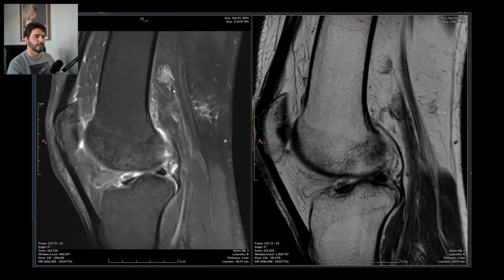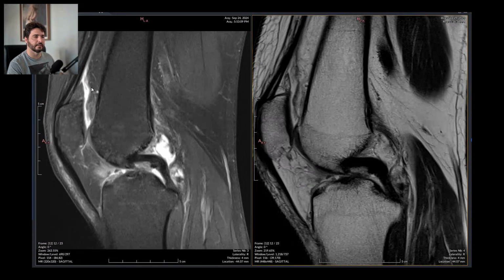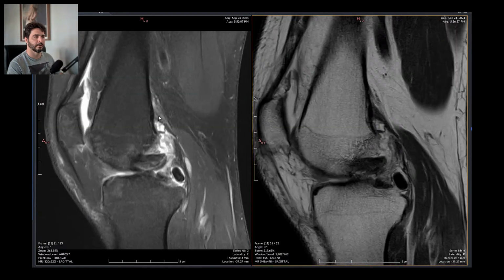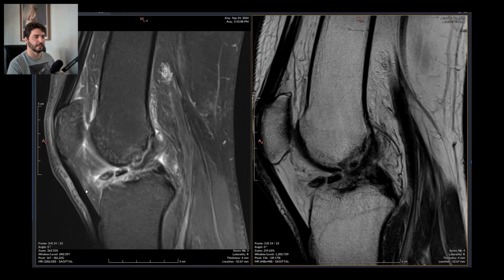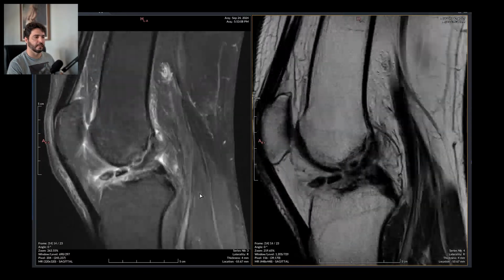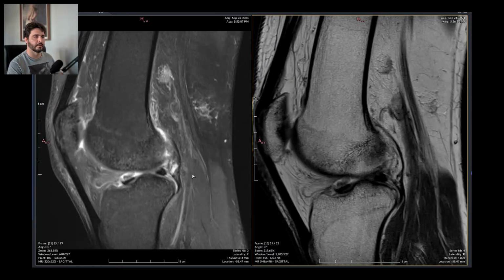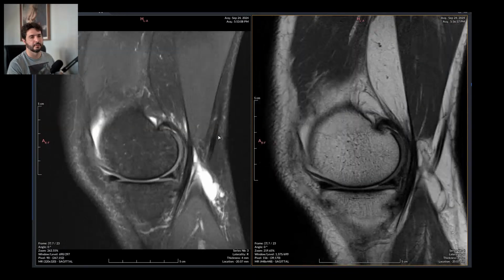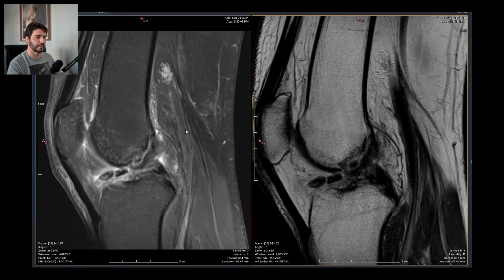First of all, there is edema all over the place. There's a small articular effusion, clear signs of synovitis. It's all blurred on the margins, and there is edema on the fat pads. Also, these are popliteal lymph nodes, quite common on these cases of acute arthritis.